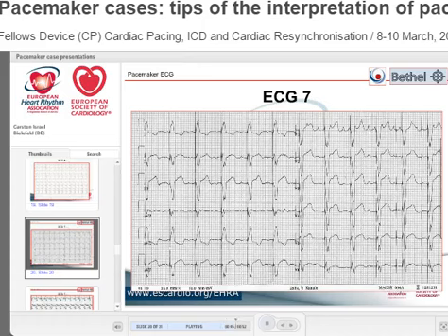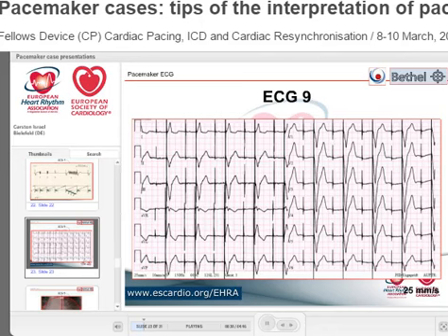And I have one more topic that I like very much. This is, to be honest, a very boring ECG, right? Dual chamber device. Atrial pacing, correct? Effective? Yes. You see a P wave after each atrial spike. The P wave is always at a regular, similar interval after the spike, so it's not just coincidence. The sinus rhythm is never the same. It always changes a little bit.